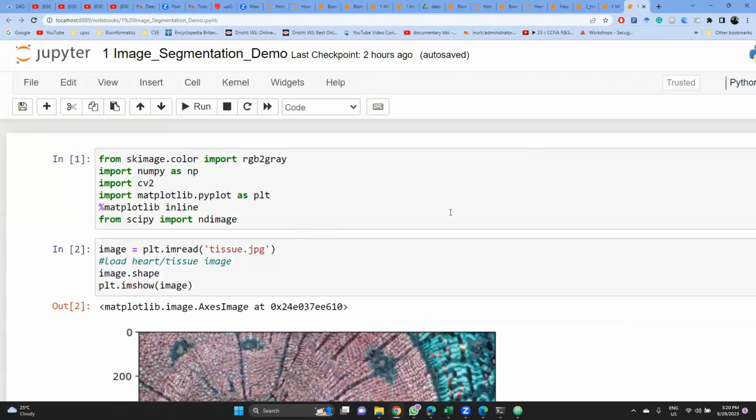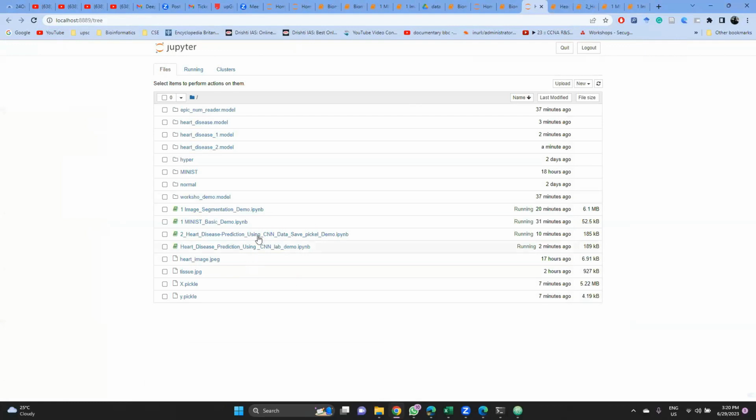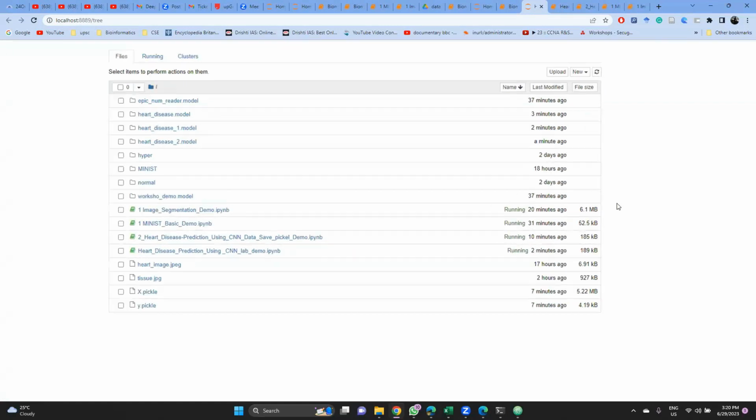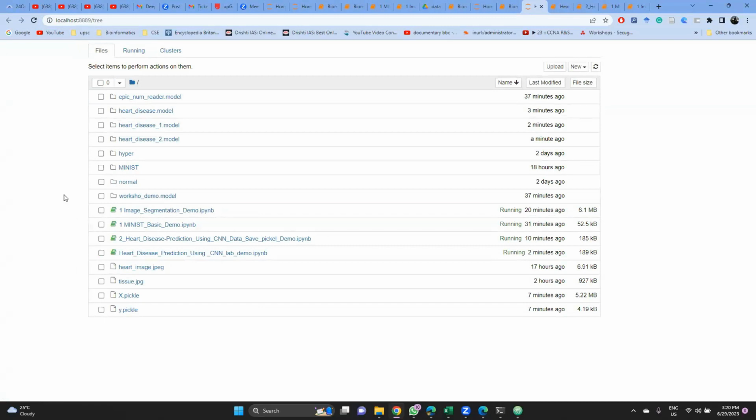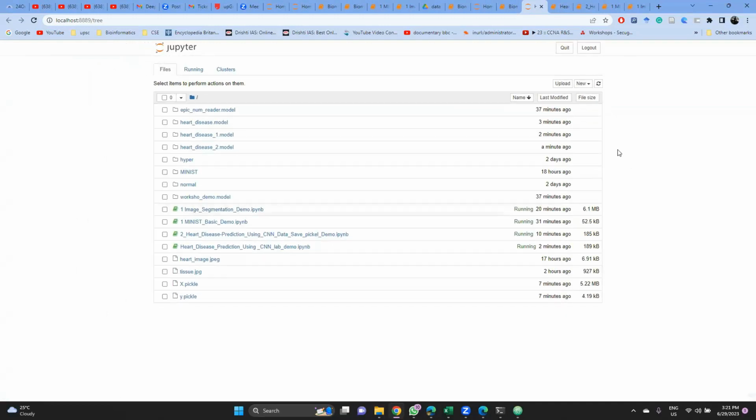So in this way, we will make our machine learning model. I think I have completed all the sheets, and I have demonstrated how to build a machine learning model. Tomorrow Aman sir will be demonstrating to you how to port this model to Android based applications, and how to perform that and run that analysis also.